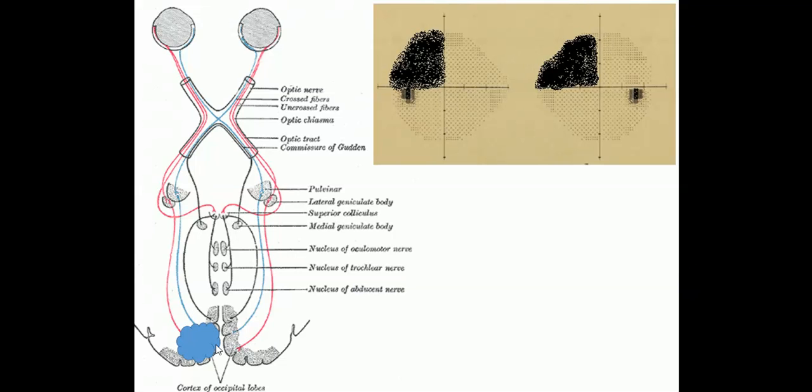And there's an added layer of explanation that we need to provide here. As you can see, what's being affected not only is the left side, but it's the left upper side of each zone. And as we remember, everything's inverted. So the fibers that would be affected in the retina in this case would be the lower fibers of the retina. Or this is the signal coming from the lower fibers. And the signal coming from the lower fibers would translate into a particular location in the brain.